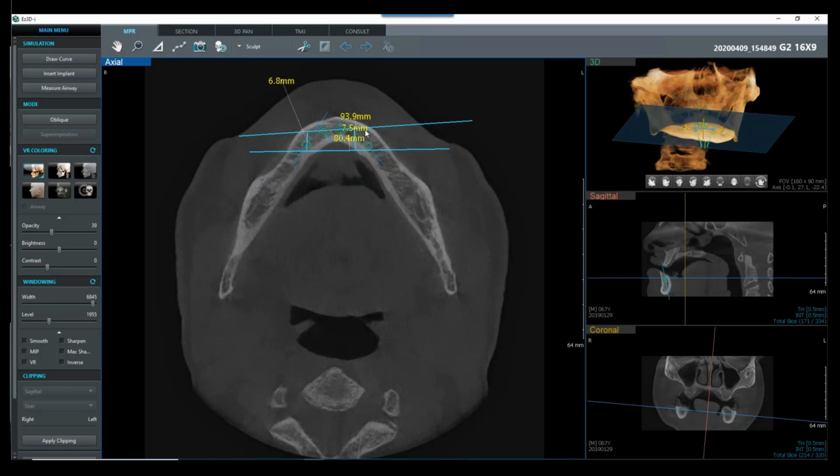And now we know that we need to change either 1.5 times that number or 2, depending on the material we're using and the individual setup. There are a lot of different clinical questions here. In this, we're just showing how to use the software specifically for the Vatech, what we can do with our software here. So let's go up to there, and then we would draw another line across. And that's going to be our distance for our AP spread specific to that.